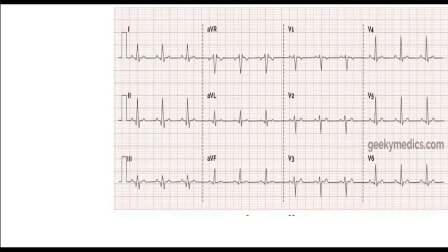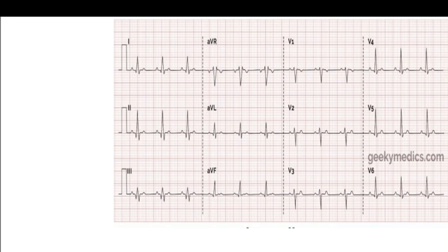So in this lecture today, what we are going to discuss is how to read an ECG. If you look at an ECG randomly, you might miss some important feature. So it is important to read an ECG in a sequential way. By that I mean, here we have an ECG.